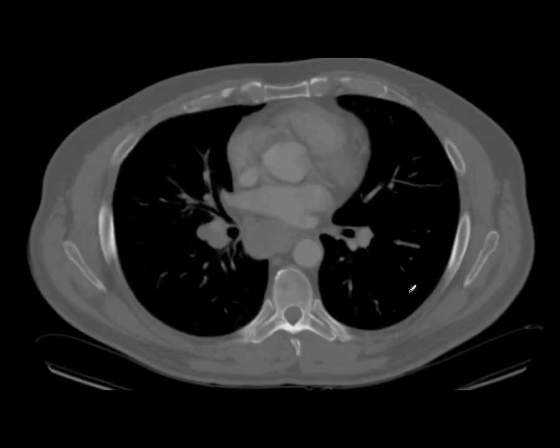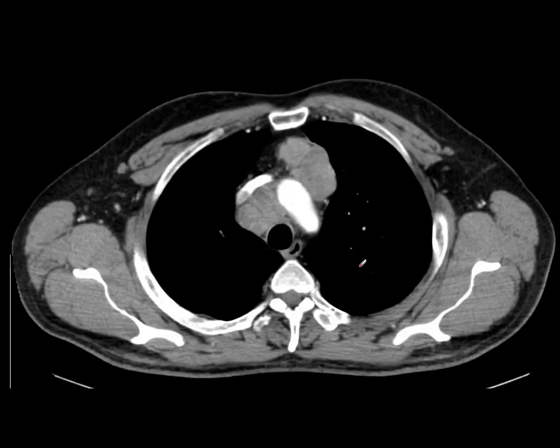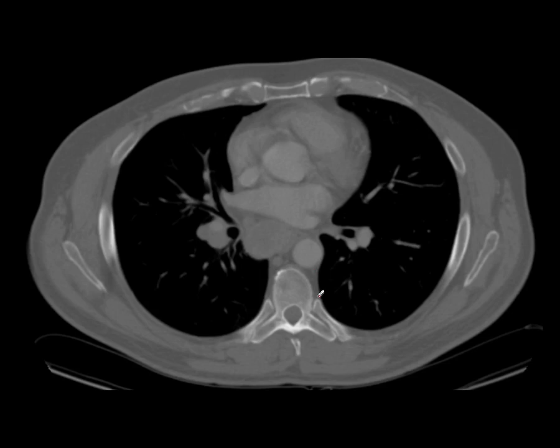Looking at their bone windows, this area looks relatively normal, but there's a very small area of vague lucency here. You may not even see it. That's fine. So this looks normal. If we performed a bone scintigram, it would probably be normal. If we performed an MRI scan, we would likely see a metastasis here. So we will have reported this CT scan saying extensive nodal disease, no bone metastases.